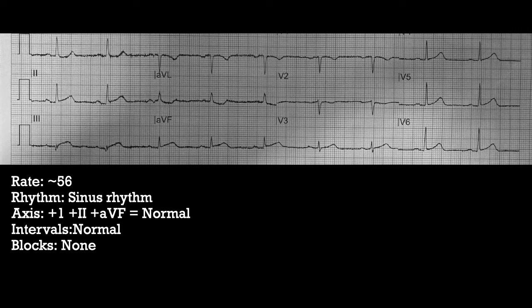That's definitely below, and the T wave is inverted there. So that looks abnormal. This is either a reciprocal change or this is potentially ischemia. Something looks abnormal with AVL and maybe a little bit with lead 1 as well. When we look at infarcts and that kind of stuff, looking in the inferior leads, now we get to the big spot, the money shot.